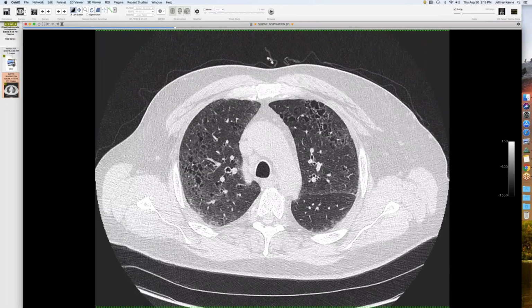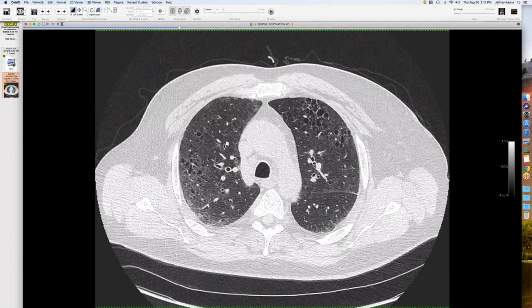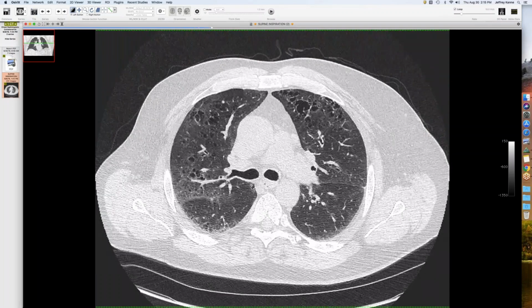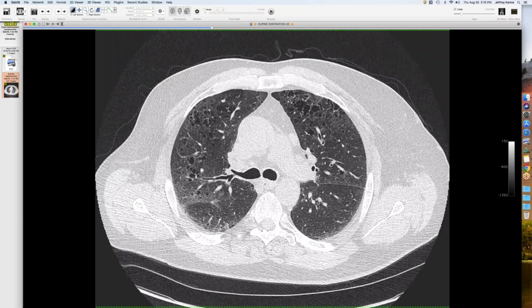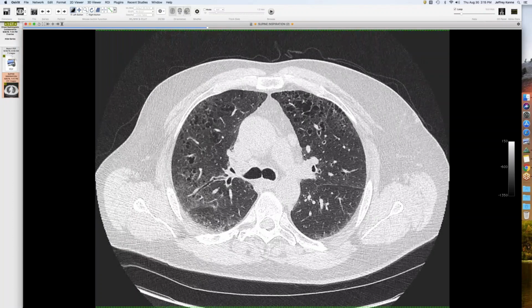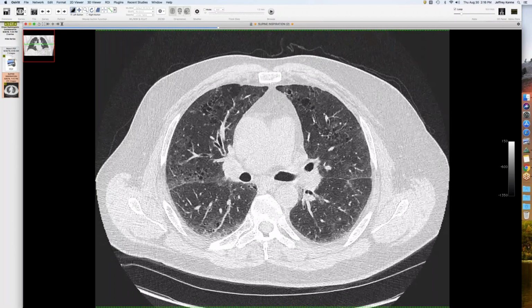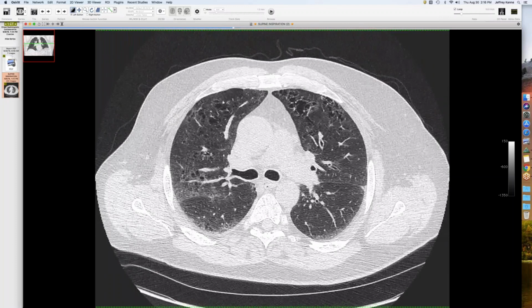There's probably some fibrosis, well known in smokers, accounting for some of the distortion, some of the ground glass, and overall increased density. And there may be a few cysts that are related to Langerhans, but I don't like it for true PLCH. I'd like to see more even distribution of the holes, not just on the periphery, but more central in the lung, and maybe some nodules in the background.